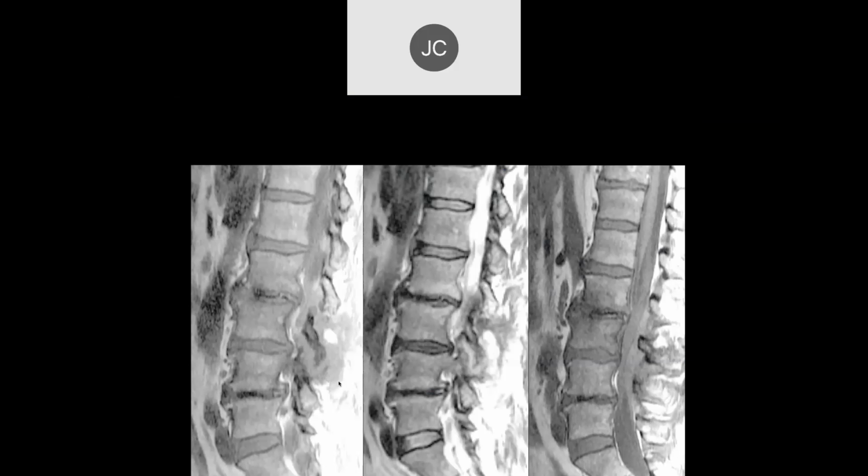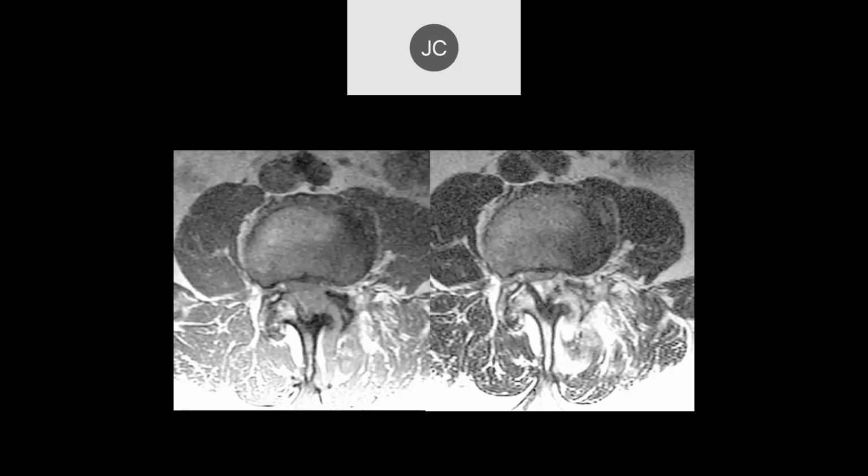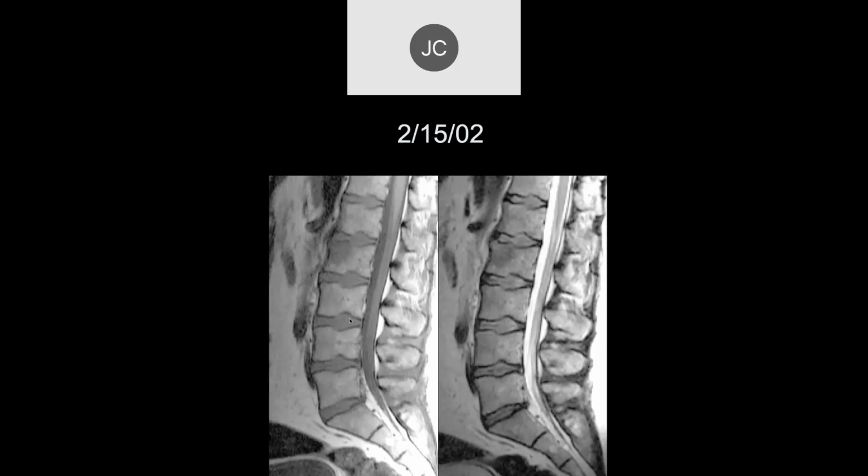And here again, we can see a lot of soft tissue thickening. This is in the facet joint, marked irregularity and destruction of the facet joint. Here we can again see degenerative disease on the right side. Looks like destruction on the left side with inflammatory tissue going into the neural canal as well as peripherally. This was another infected joint.